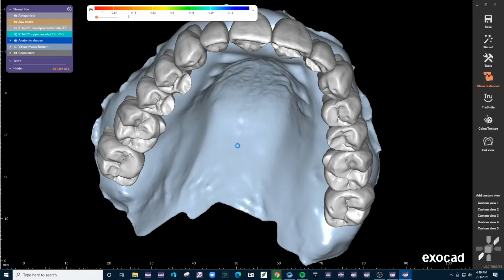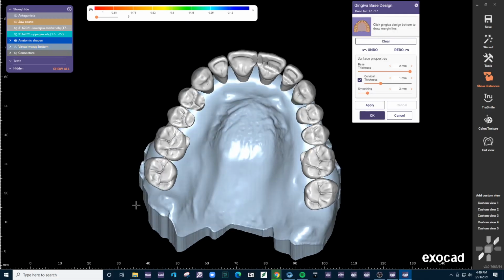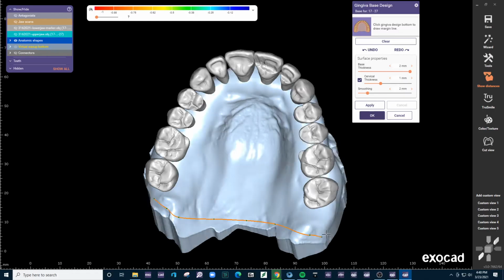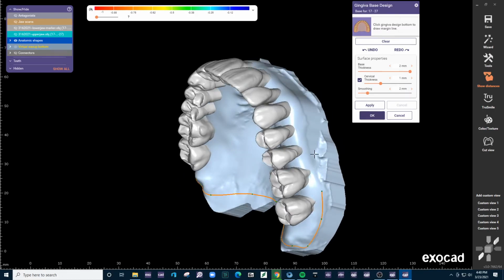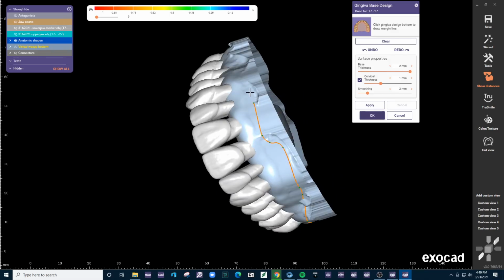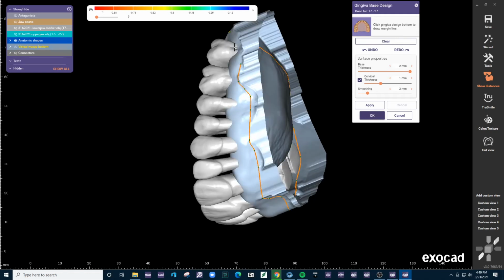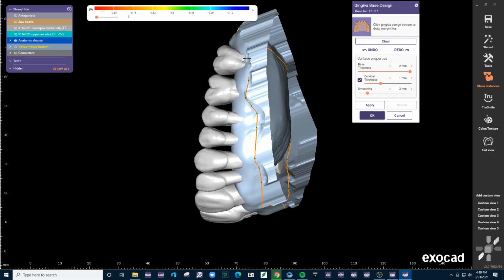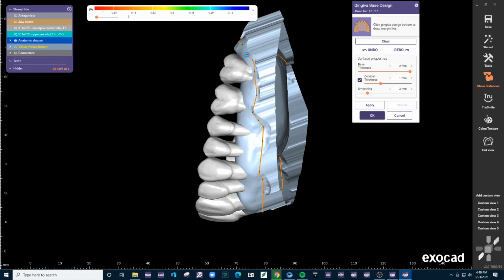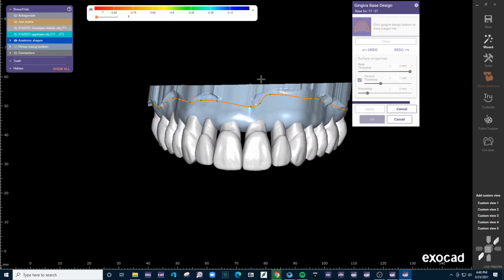Denture base design. Yes, we want a single piece. And here we'll make the denture base thickness 2 millimeters. I think that this is actually okay. Some of you might say, isn't that too little? Yes, technically it is, but we will just thicken it up shortly.